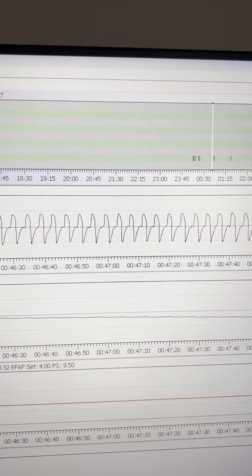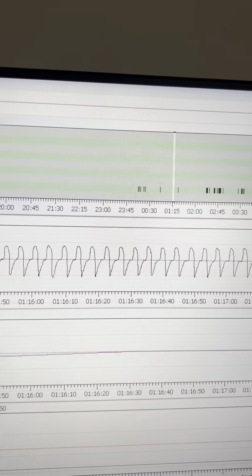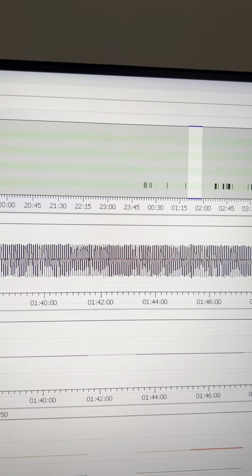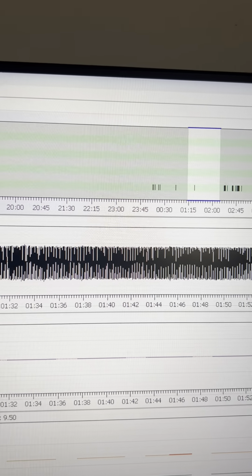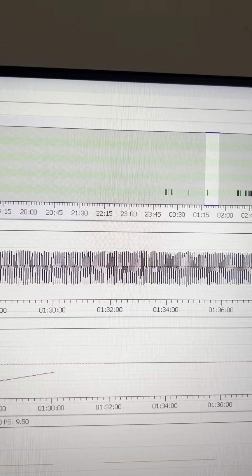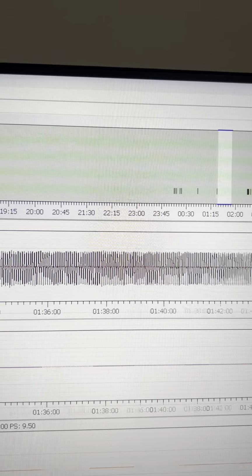Going further now, more into the night. Here I'm getting more deep sleep, so we're not seeing a lot of things. As you can see here, the pattern is pretty just a line. It still goes up and down though, and here you can see some sort of collapse.